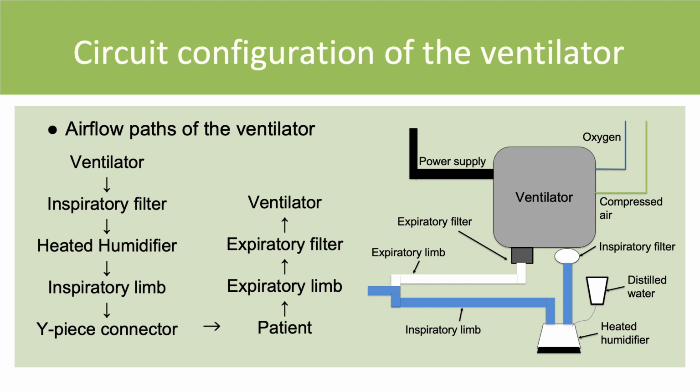In the case of using an artificial nose, the artificial nose is attached to the end of the Y-piece connector. Using the heated humidifier and artificial nose simultaneously is prohibited due to the risk of clogging the artificial nose. Let's go over each of the components in detail.